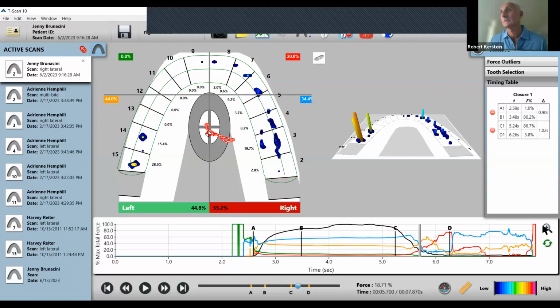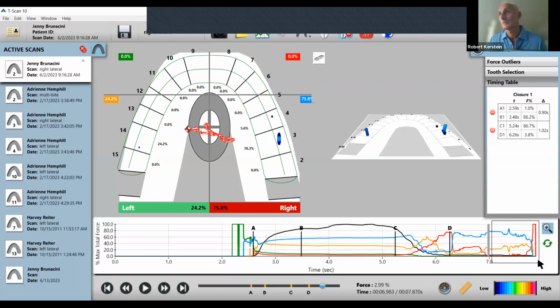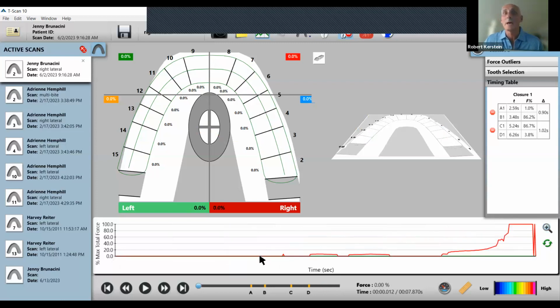And if that's hard to see, here's another feature. You can click on this and you can actually make a little bit of a zoom window. Whoops, see if I can do that. Try that again. That won't let me do it at the edge of the graph. Let me try it a little closer. This is an important feature also, so I want to show you. See, now it blows it up. It actually blew it up too small. Let me see.